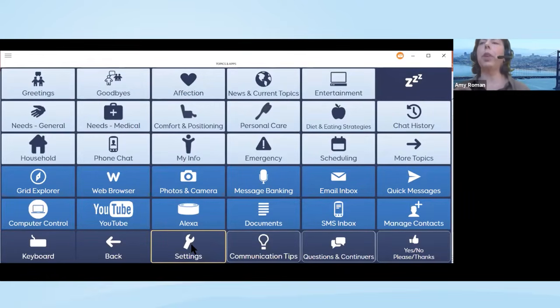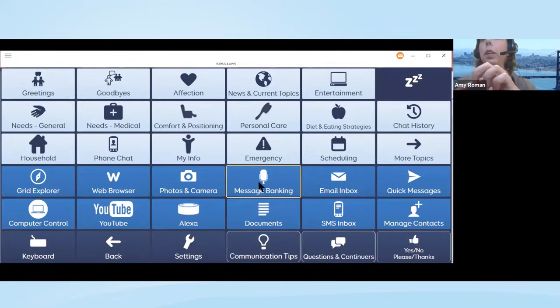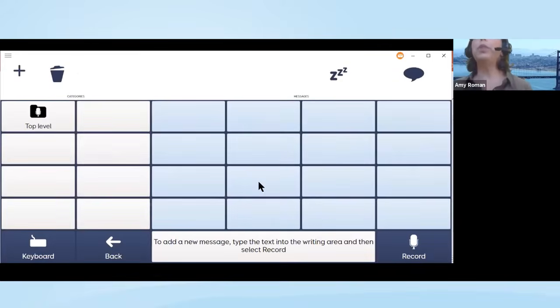That would be great. If you have already done message banking, I've incorporated a page in AlphaCore that works really beautifully with the mymessagebanking.com website. The mymessagebanking.com website, in a nutshell, labels all your messages. So you've recorded your WAV files.